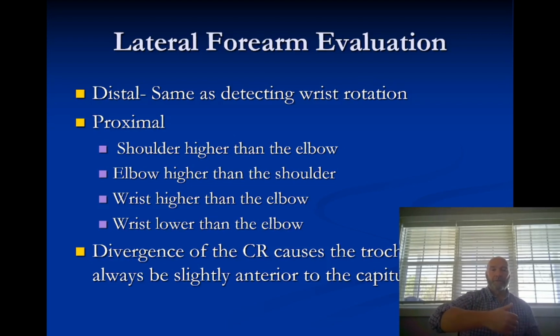If you've got the other possibility, where the side that's furthest from the image receptor is projected proximal, then the patient's just too low, their shoulder's depressed and their elbow is elevated. We're going to dial that in a little bit tighter when we get to the forearm in a minute. We're naturally going to have some distortion of the condyles for the lateral of the forearm, again because of the divergent central ray.